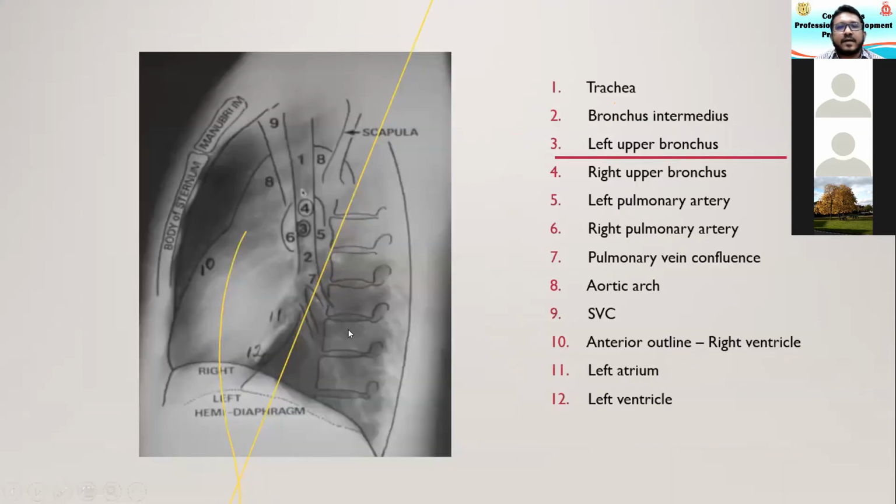Okay, and then it comes to the lateral view. You can always see a lot of things on the lateral view. The center is busy, but you have these 2 areas which are called the retrosternal space and the retrocardiac space, which usually have equal density of radiolucency because of the lungs, but the rest of the mediastinum is a little bit busy.